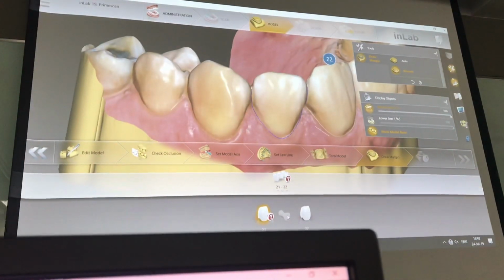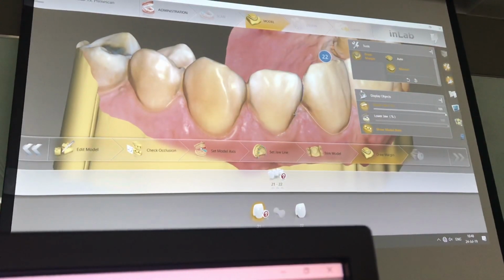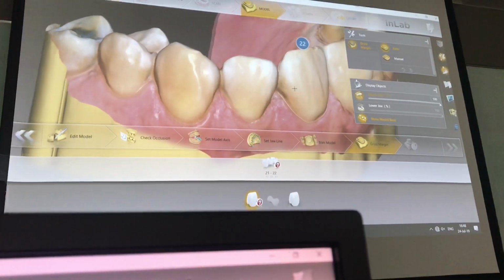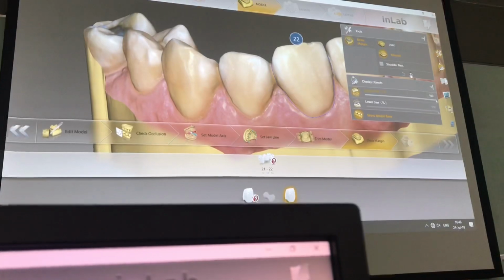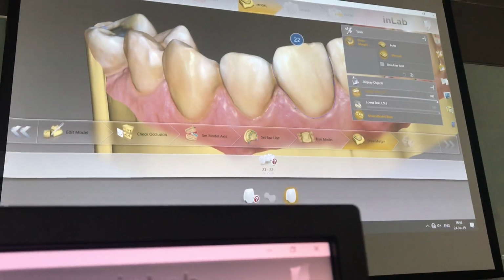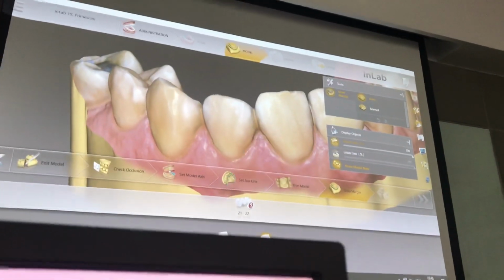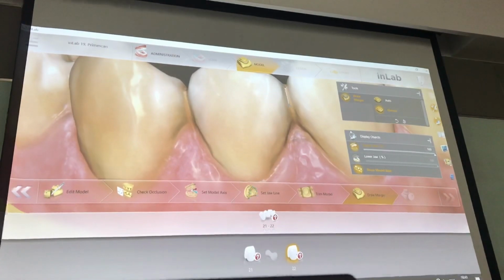Okay, my bad here, sorry. You know what I've done wrong, right? At least I recognized my fault right at the beginning before to reset. So I usually say, notice the highlighted tooth before marking the margin, and I commit that mistake. So do that.